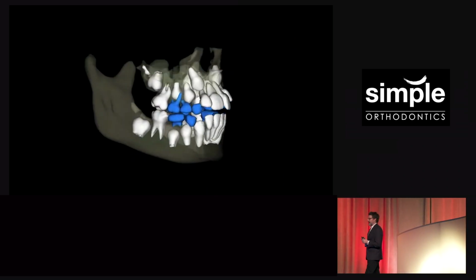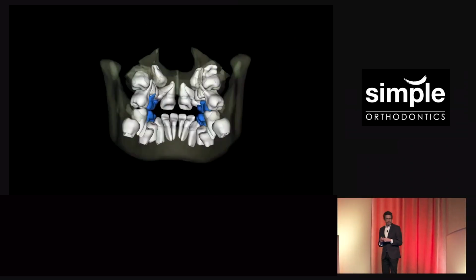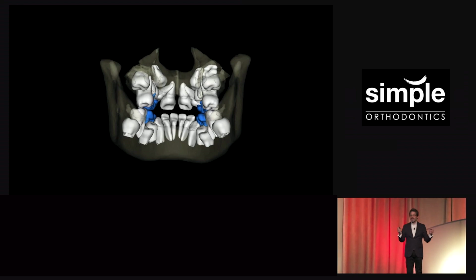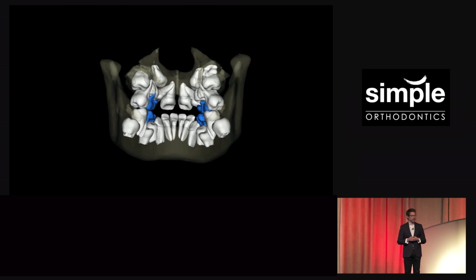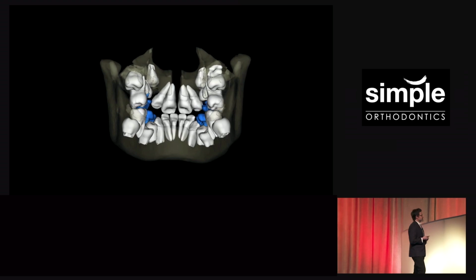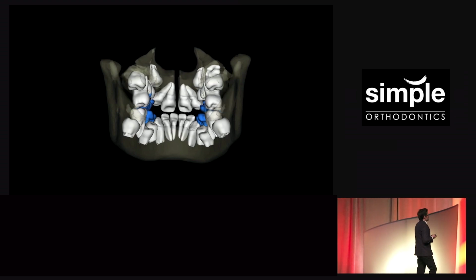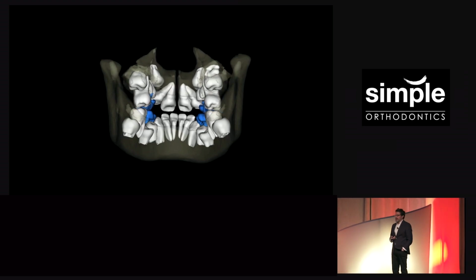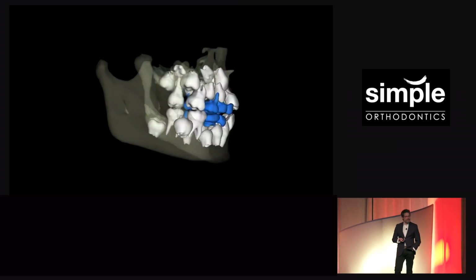If you're going to expand, is it going to be dental borne? If so, which teeth are you going to grab? If you look at the decompensation of the maxillary molars, if I put them back into their normal curve of Wilson, normal axial inclination, notice how big her transverse discrepancy is. This is my rehearsal. This is what I want to do. And now I have to scratch my head and say, how can I do that?